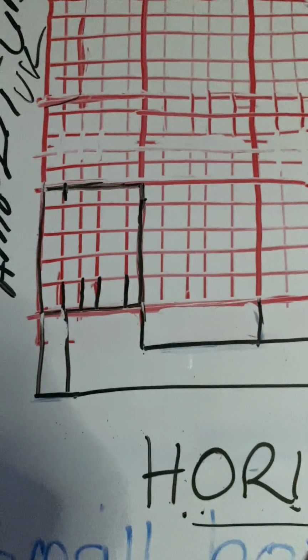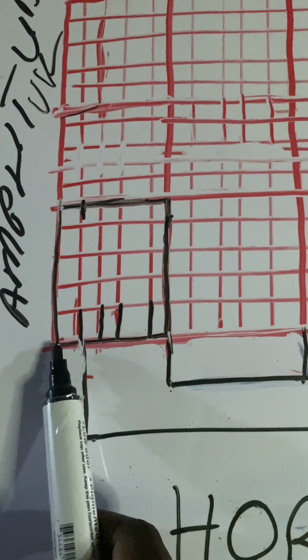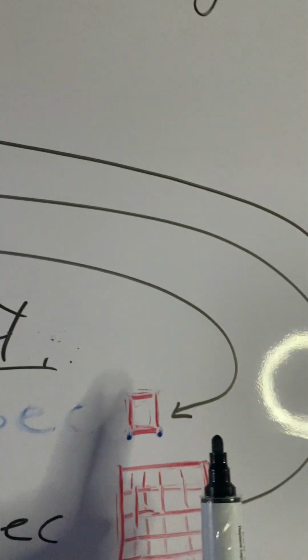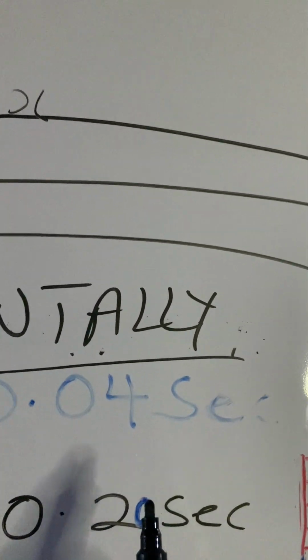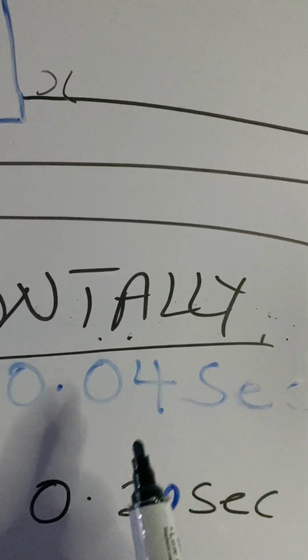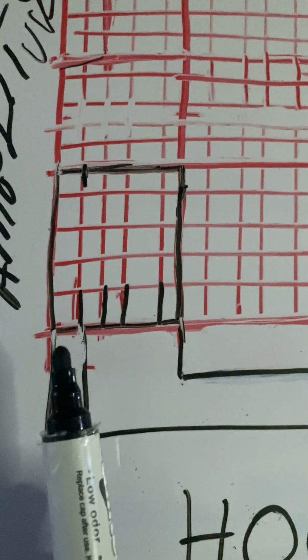When you take an ECG paper, one small box on the horizontal axis, when you bring it this way, you see a small box like this is equal to 0.04 seconds. All right, it's equal to 0.04 seconds. This is one small box, something like this is 0.04 seconds.